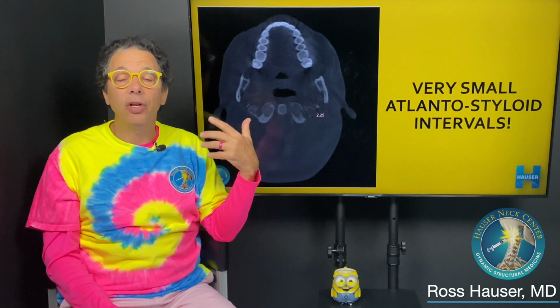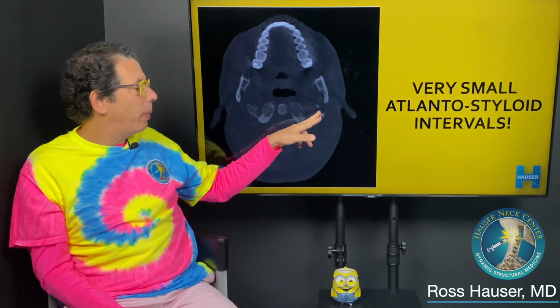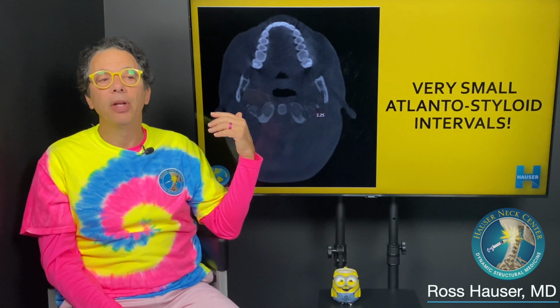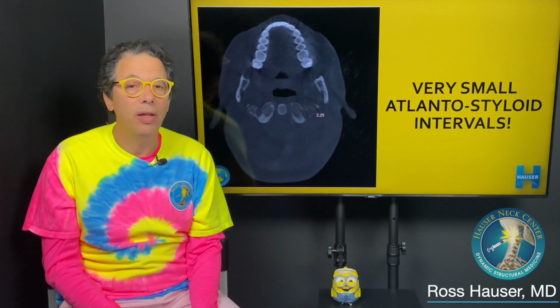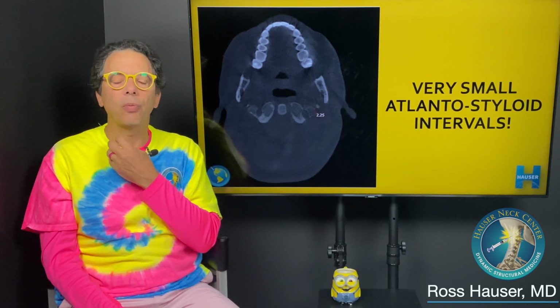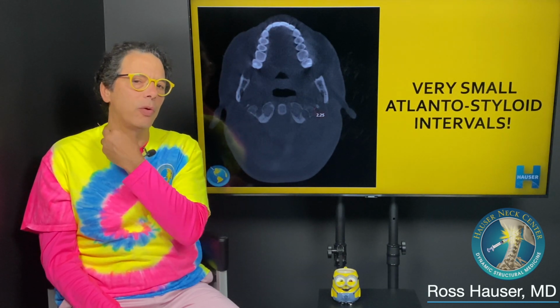So this is a patient who might need a styloidectomy, because the space is so narrowed that even if we correct their curve and increase the space by 2 to 3 millimeters, the jugular vein is going to be too compressed. And always remember, if the jugular vein is getting compressed, probably the other things in the carotid sheath may also be getting compressed, such as the vagus nerve, the glossopharyngeal nerve, that's swallowing and blood pressure, and the spinal accessory nerve, which I talked to you about, that relates to my condition.